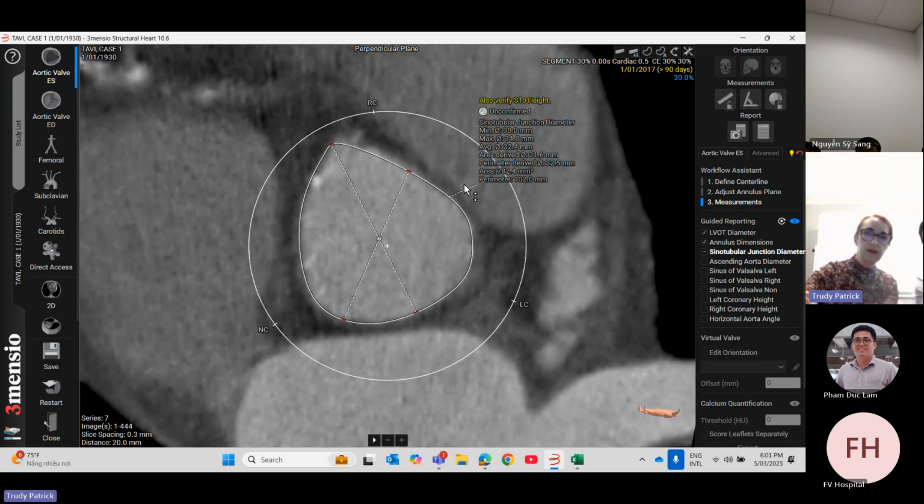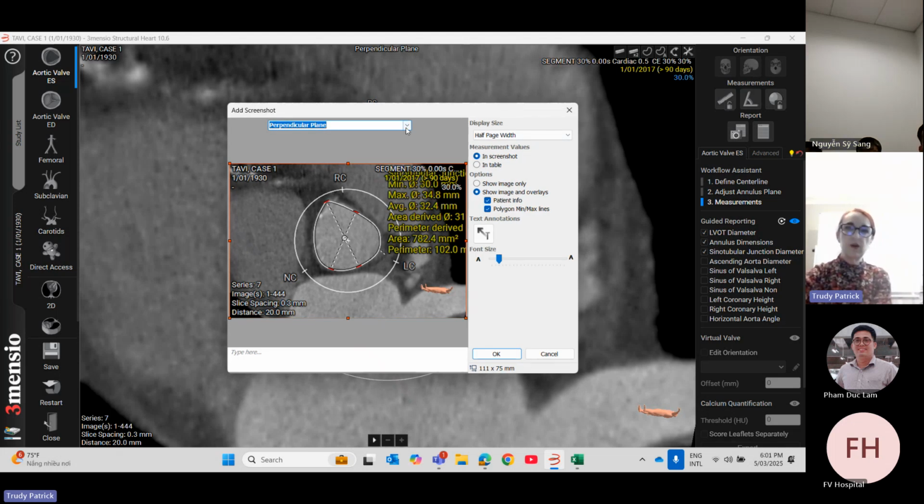Sorry? Can you unzoom and show them the other views as well? Yeah. What's that? So I was just going to run through this. Same. So they want to see the other. They don't know what they're. Oh, okay. So they want to go back. Like double click here and then go out of this. Yeah. Okay.